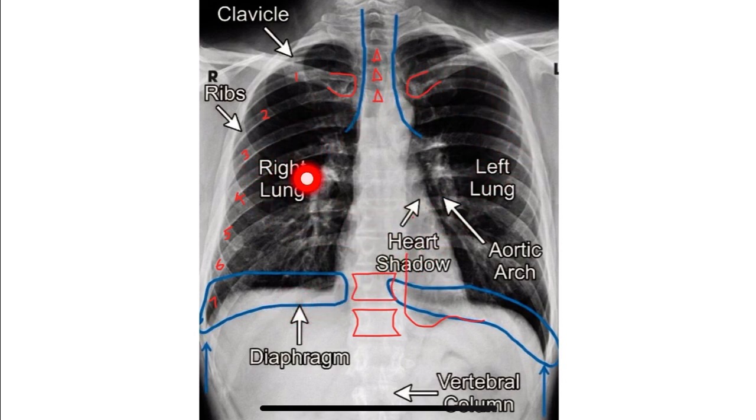At last, we are looking for any fractures of the ribs. Here the clavicle is usually fractured in the middle 1/3 in a road traffic accident, and the ribs are also fractured in the middle 1/3. If the fracture is involving more than 3 consecutive ribs in at least 2 different places, it suggests flail chest due to paradoxical movement of the chest.